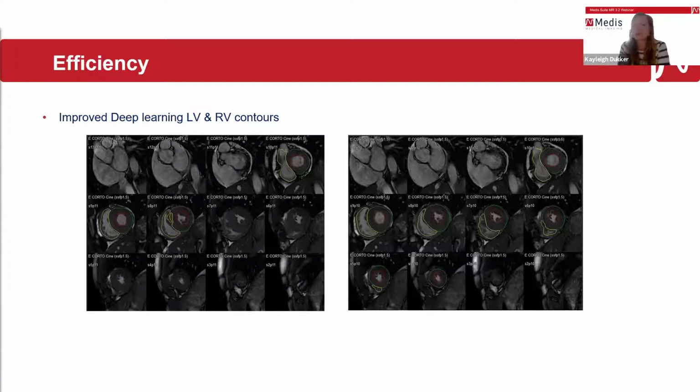The initial feedback that we got from our customers, whom we asked for feedback on how it had improved on different cases, is that it was actually very much improved, and that currently they only need to change some limited slices and often only in either the base or the apical slices. Also from the pediatric sites, we got very good news that with this algorithm, they don't need to draw the contours manually at all. They can just change them a little bit.